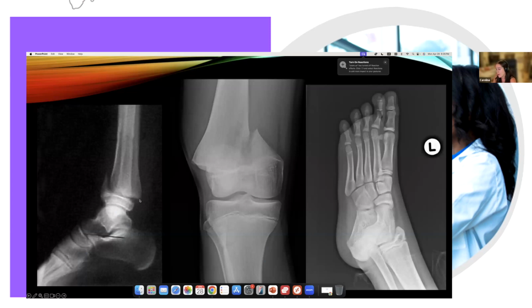So there you go. I wanted to mainly show you the most common. So we have here a fracture through the growth plate and exiting through the metaphysis. Again, growth plate, metaphysis, with some dislocation. So this is the distal tibia, this is the distal femur. And these are actually Salter-Harris type 2.